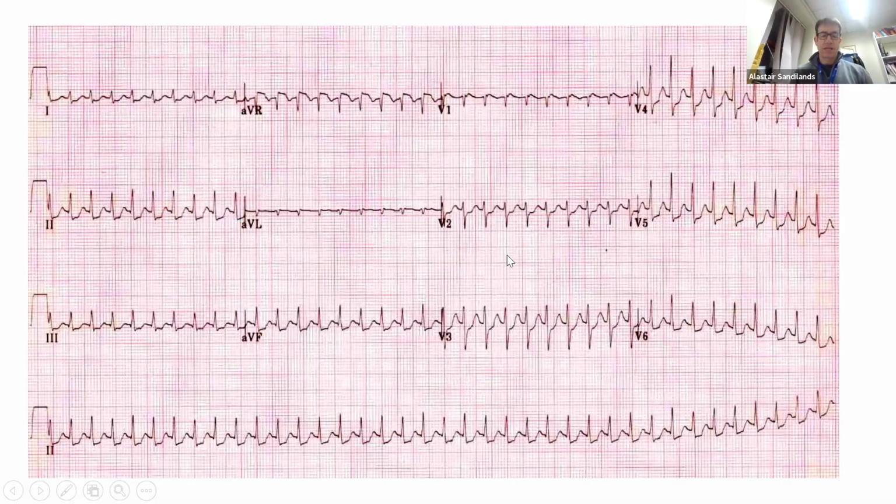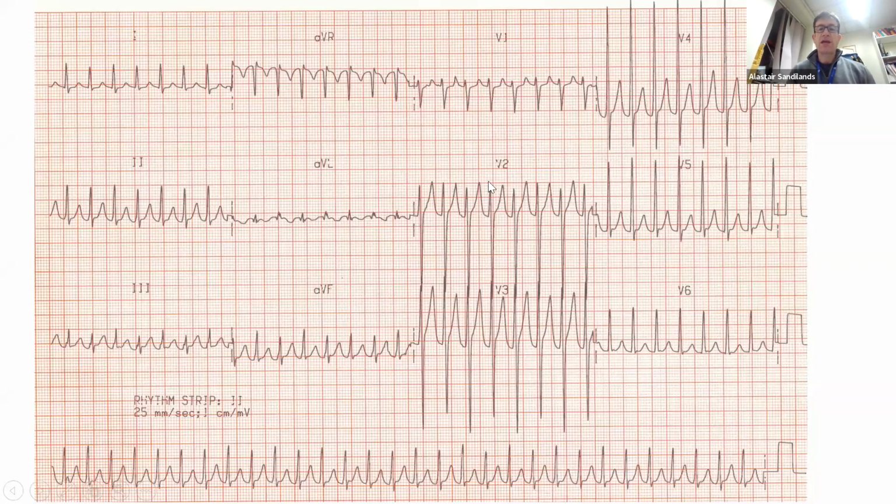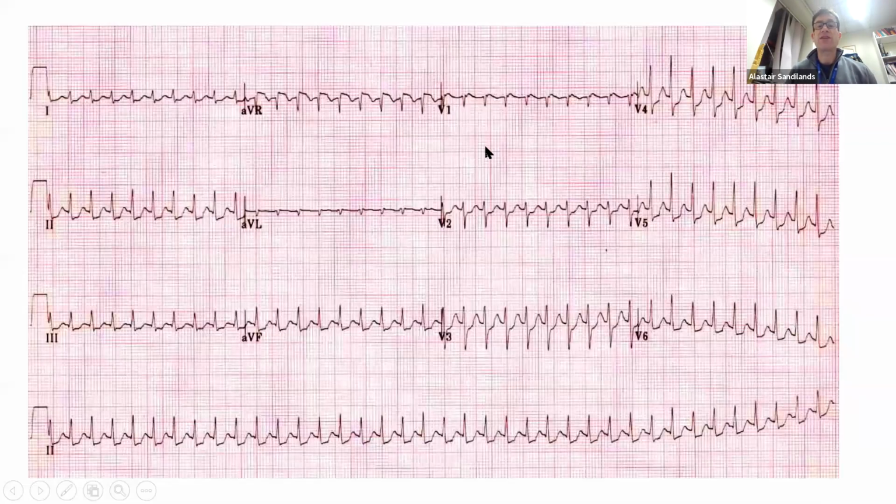Now, basically, in actual fact, this is AVNRT. You wouldn't be expected to get this. The reason why this is AVNRT is that if you actually look, this is the P wave buried in V1. That's the simultaneous activation of the atria and the ventricles together. So there's a little bump there as the P wave afterwards. You're not expected to get this. There's the P wave just there, probably just buried after the QRS.